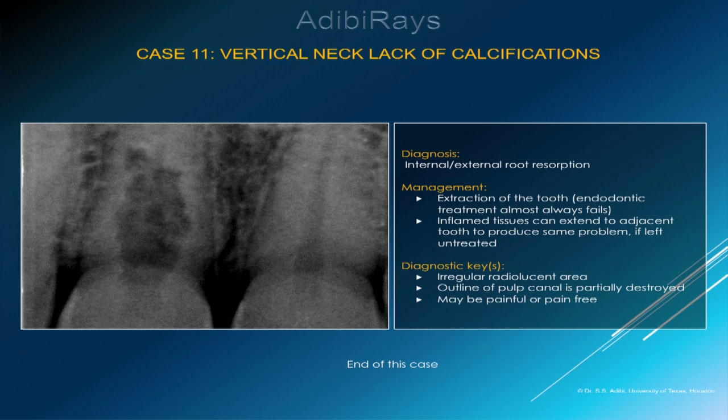The diagnosis is internal and external root resorption. Most of the time, endodontic therapy fails on a case like this one. It is important to treat the condition quickly because the inflammatory condition may extend and affect the adjacent tooth.